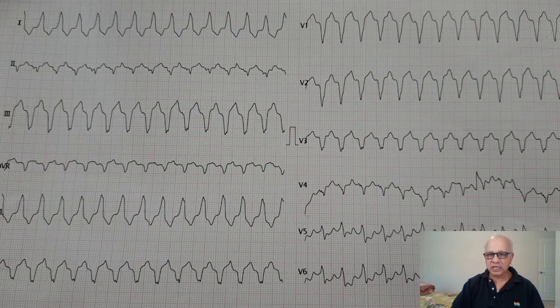Now this is an interesting ECG. You should look at it very carefully. This was the ECG sent to me by Dr. Hari Krishna, who was working with me in Baby Memorial Hospital. It was the ECG of a 60-year-old gentleman who was on treatment for coronary artery disease for the past 2 years. Now, my question is, what do you see in the ECG? That means, what is your diagnosis?